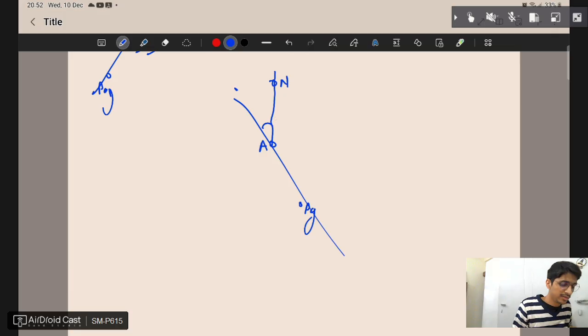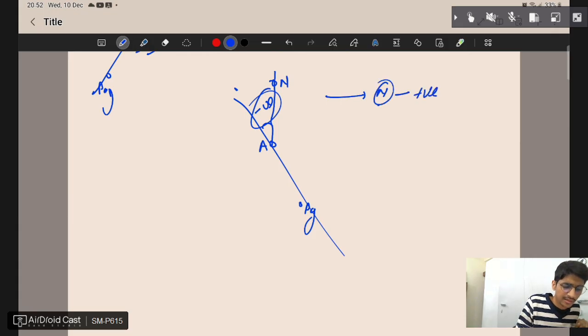So now from this it has to turn to this. That means the positive value has gone to negative. So in class 3, it is basically negative. So what our basic inferences are is that in normal cases it is positive. In a class 1 situation it is 0.